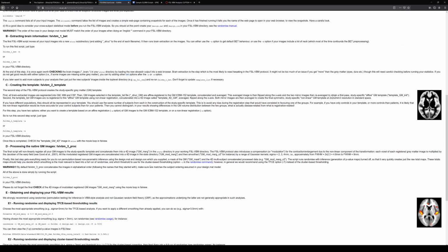Here's how we can think about it. It's a standard space, and scratch that. Sorry, it is a little bit different than MNI 152, but this ICBM 152 template is the space that it's creating a template. So this is what we call, again, a study-specific template. Don't need to worry so much about it, but this is what is the appropriate method to do a VBM analysis.